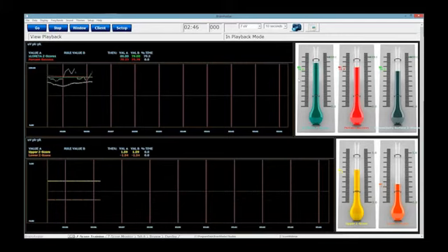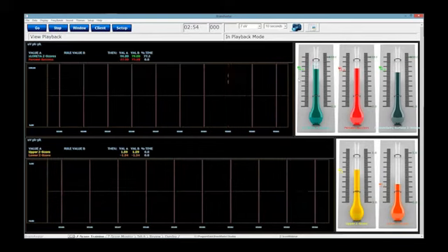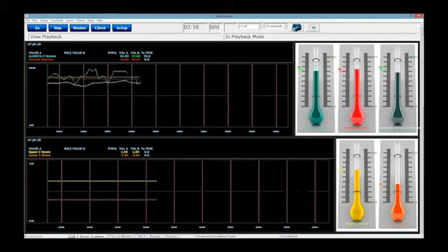As you can see, for the most part, most controls are exactly the same, whether you're doing Surface, sLORETA, or both. U is going to be your upper threshold. L is going to be your lower threshold.